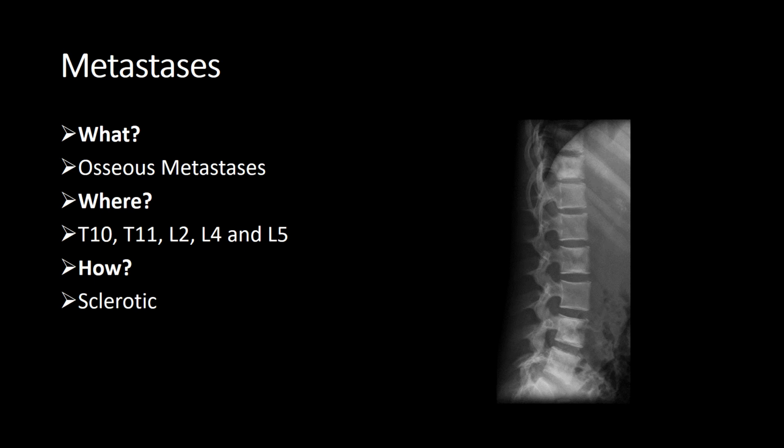So this is a really young child, unfortunately. This is an 8-year-old with a neuroblastoma, and we can quite clearly see that we've got really diffusely abnormal sclerotic mets throughout the vertebrae. So if you look at L3, L3 has been completely preserved. So this is a very normal vertebra in comparison to all this abnormal sclerotic mets everywhere.